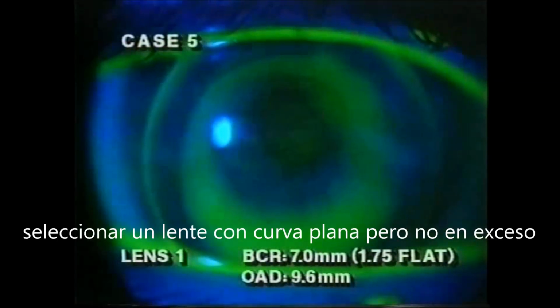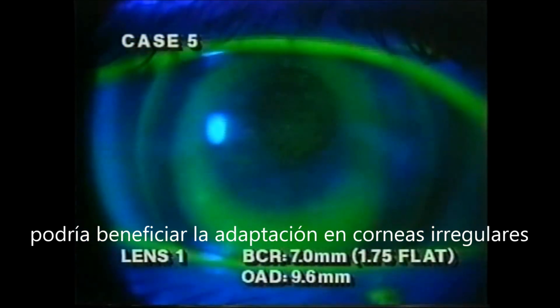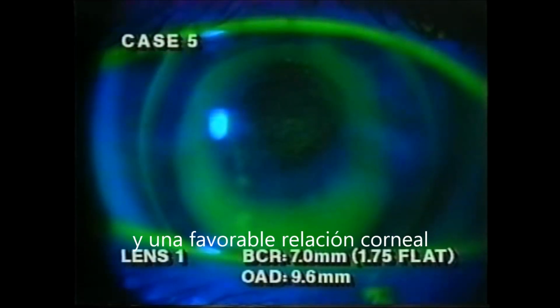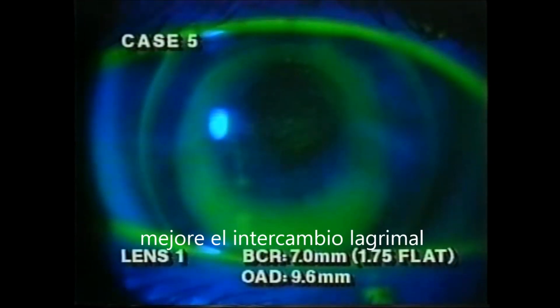Selecting a flat base curve radius, if not excessive, can be beneficial for fitting irregular corneas. A flat spherical fit may allow for good visual acuity, comfort, and a favorable fitting relationship, providing the optical zone diameter is not much larger than the apex of the cone.